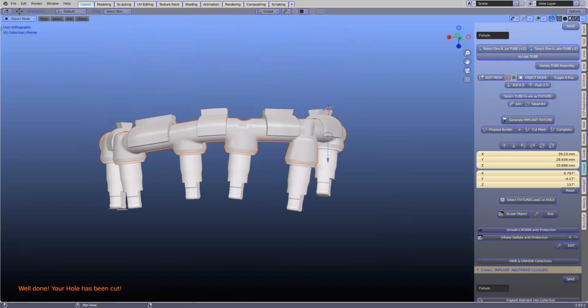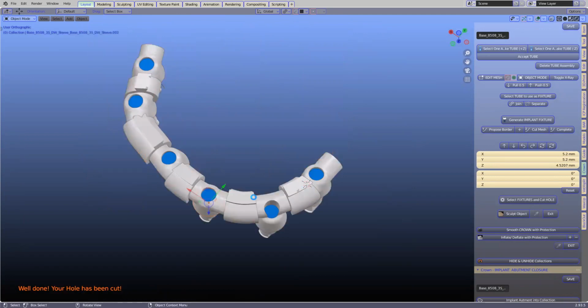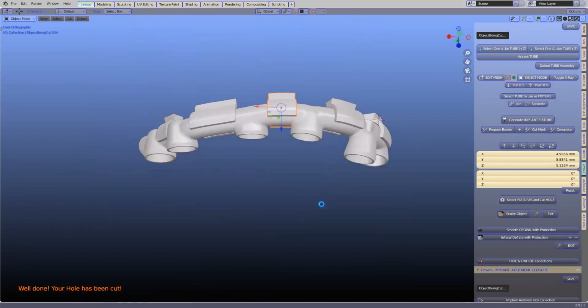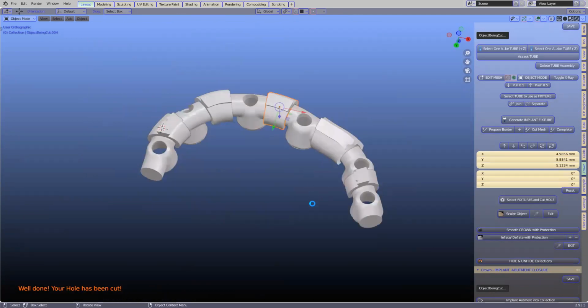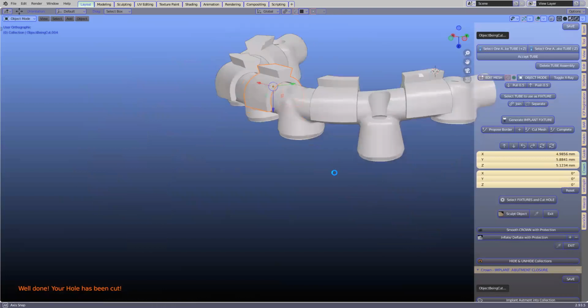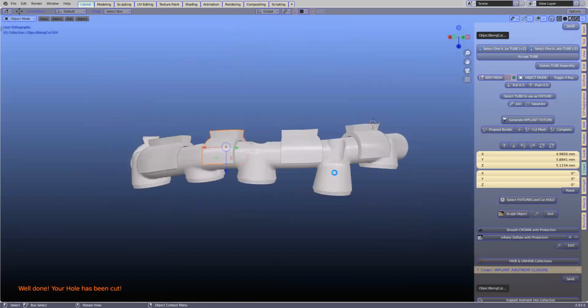Okay, let's have a look at it. Yeah, that's it. So you've got the duplicate caps in there still. Yeah, that's what it then looks like. Beautiful, isn't it, Wolf? Yeah, looks like plumbing. Absolutely magnificent. Get out of it. You've been doing too much plumbing in your life. Okay, stop share.